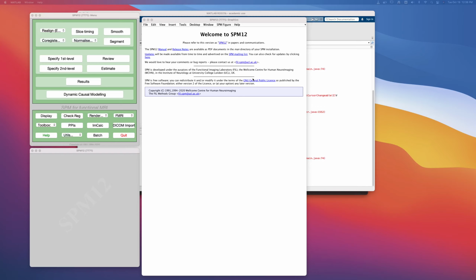Because you could always process them and not look at the data, and then in the end there will be errors, and that will be a serious problem later on. So it's always good to make it a habit to use your eyes to see the images. They are images after all, they are pictures, so they should make sense to you visually.